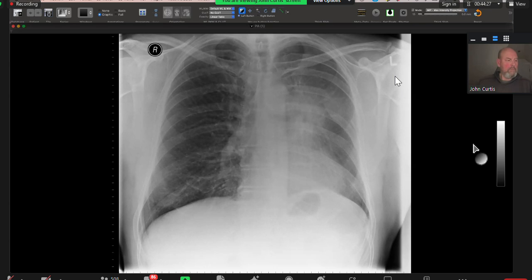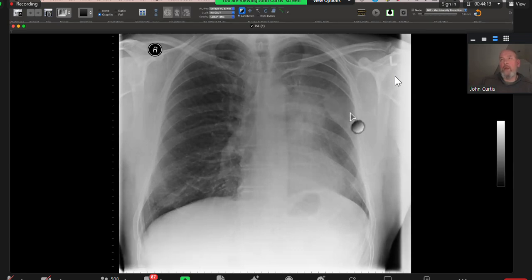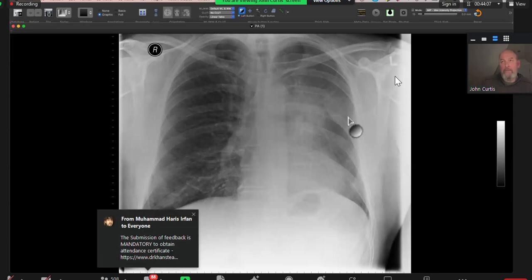And also, here in this cut, I can see that there is a missing rib, causing destruction by the mass lesion. Just show the audience that lesion. Yeah, well done. And can you see the incomplete border sign of a soft tissue mass underneath it? Yes, I can see here. Maybe this is the mass lesion with the incomplete border sign.